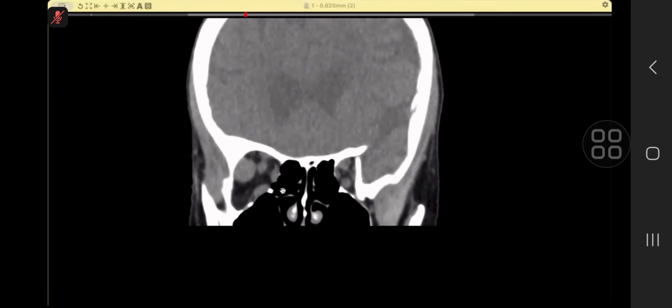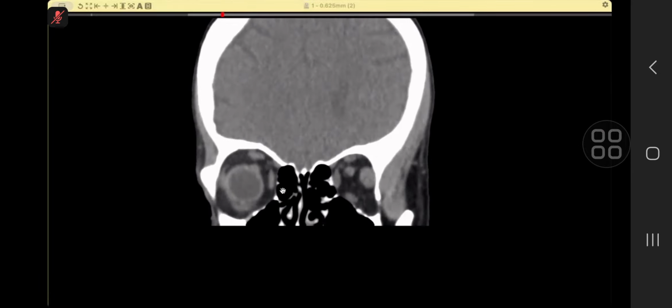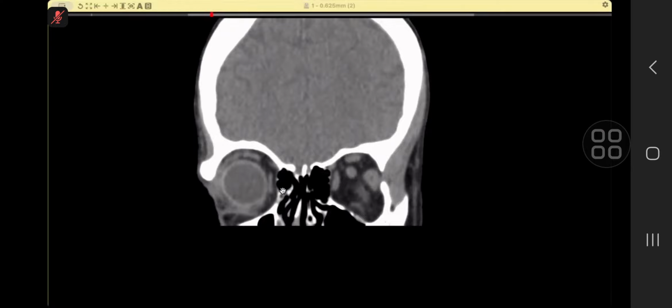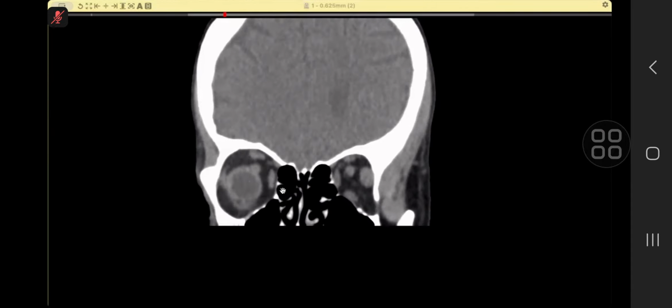Can you hear me? Yes, sir. Okay, you have done very well. What is your conclusion? Sir, my conclusion is that I'm worried about two things. One, it is likely thyroid-related orbital disease. I'm calling it thyroid-related because the myotendinous junction is not involved. But the lacrimal gland is enlarged.